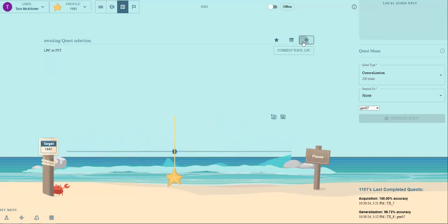Lastly, we're working to expand staRt to other audiences. For instance, we're piloting the use of a discrete Fourier transform for sounds with primarily aperiodic energy, such as s and sh. We also are actively working to improve how the software tracks the resonant frequencies of speech, and we look forward to receiving input on that from the speech community.